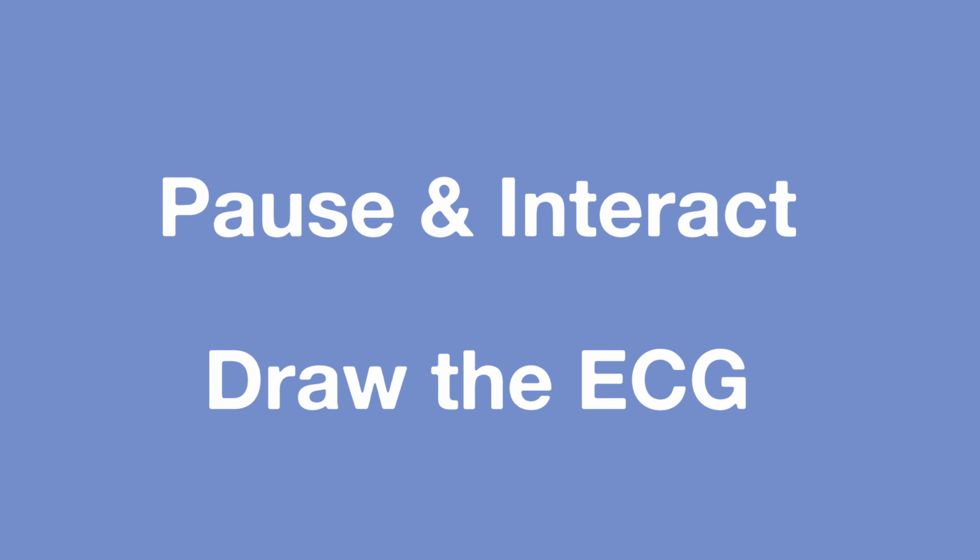Second degree heart block is a little more interesting. Now, what happens in second degree heart block is the impulse is passing from the sinoatrial node down to the AV node, but frequently you're having a failure of conduction at the AV node. So you're getting an impulse from the sinoatrial node and it gets to the AV node and it conducts. Then you have another one, it conducts. You have another one, it conducts, and then it will fail to conduct. So how would that process in itself represent itself on an ECG?